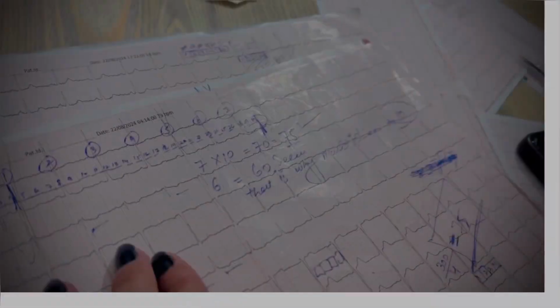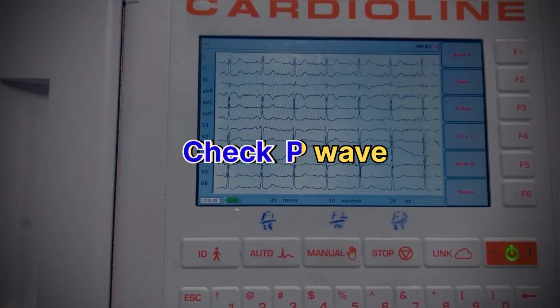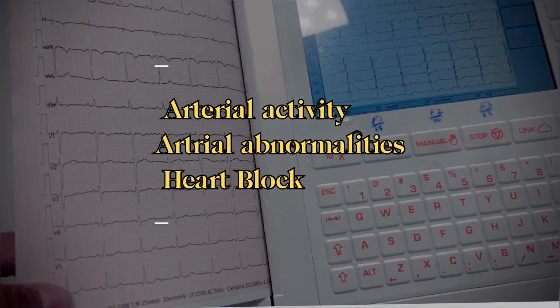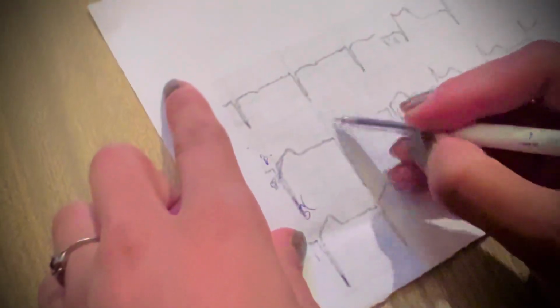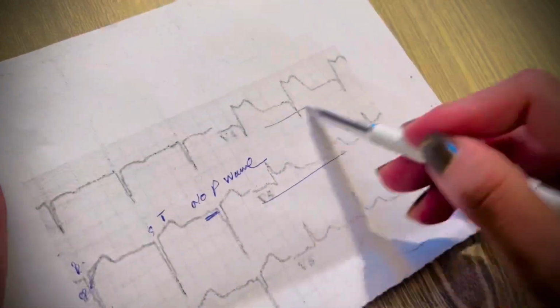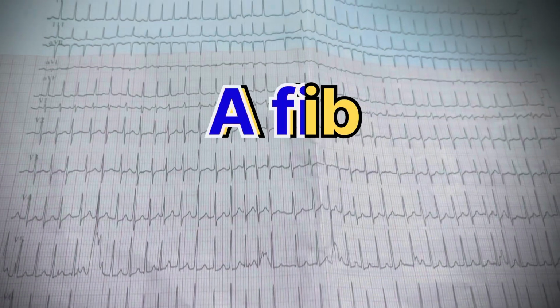The next step in reviewing an ECG is to check the P wave. First we see whether the P wave is present or not. In some arrhythmias like atrial fibrillation, the P wave might be absent or irregular. If the P wave is present, we need to assess whether it is normal or not. It's really important because it tells about atrial depolarization: are they depolarizing properly or not? A normal P wave should be upright and its duration should be less than 3 small squares.